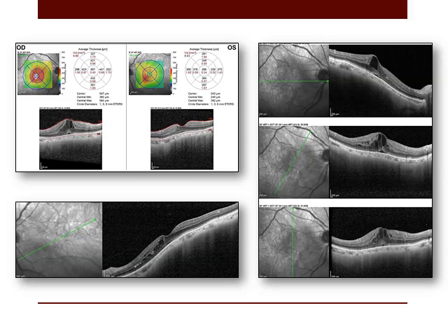Also in patients with hypopigmented fundus and in patients with myopia, never diagnose with fluorescein angiography, because there is always hyperfluorescence at the macula due to hypopigmentation. So you cannot discriminate whether this hyperfluorescence is due to leakage or due to thickening.